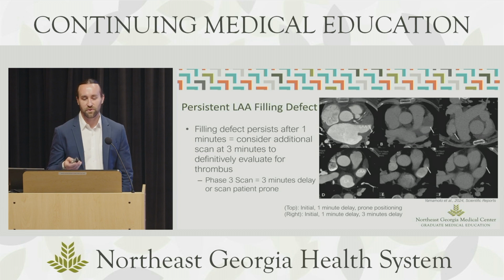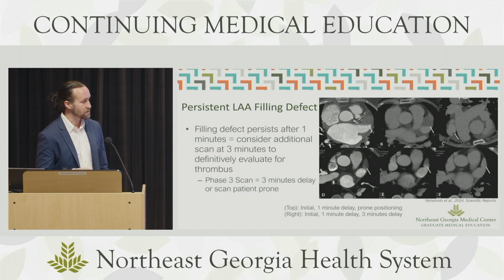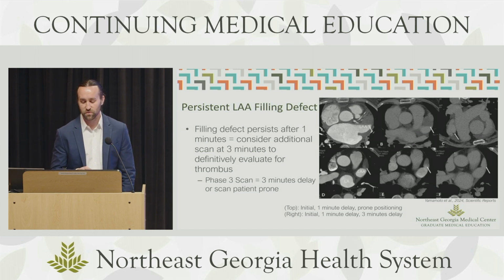Now, what happens if you still have a persistent left atrial appendage filling defect? This is something that has been noticed with cardiac CT when comparing with TEE, that some patients, just from sluggish flow or obesity or the anatomy of their left atrial appendage, are still going to have this defect even at 1 minute. So there have been multiple studies asking, is this truly some kind of thrombus? When they compared it with TEE, they noticed maybe it wasn't a thrombus. This is the one published in 2024 in Scientific Reports, which we'll talk about in the next slide, in patients that still had this left atrial appendage defect at 1 minute.